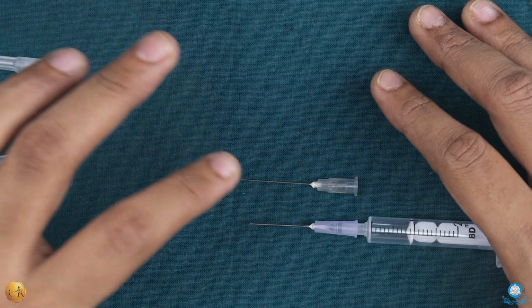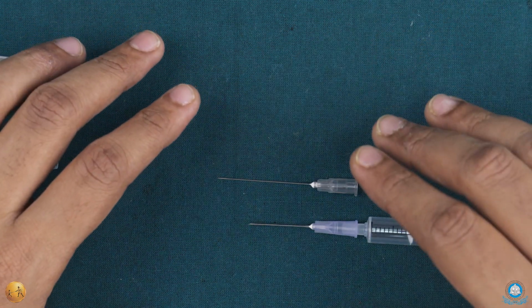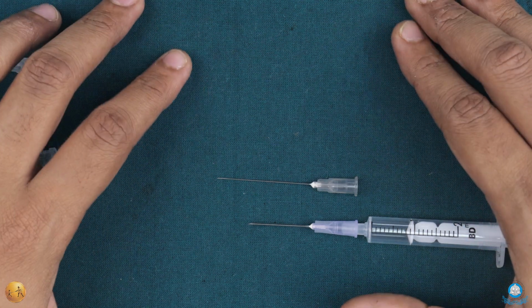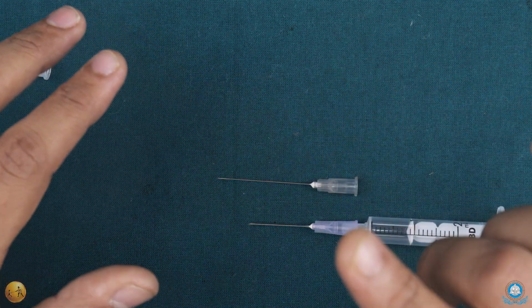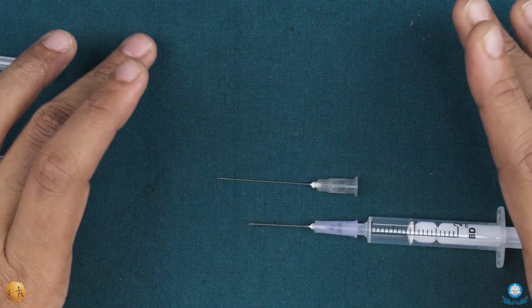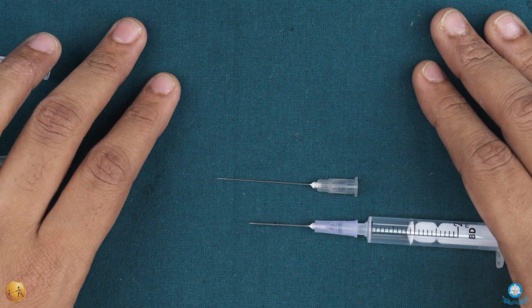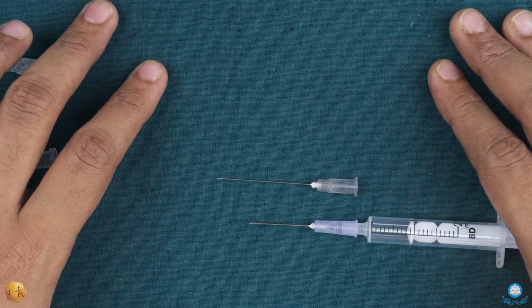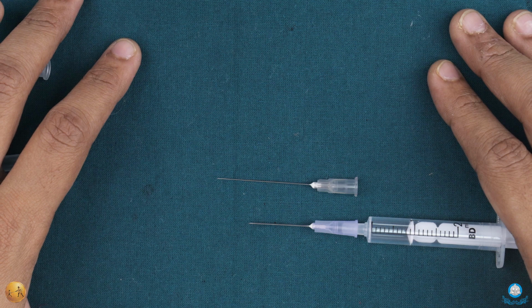Having said that, the gauge of the needle also determines the amount of deflection that takes place when you actually enter tissues. Of course, the amount of deflection of a needle is also dependent upon the density of the tissue that you are entering, but it plays a vital role, especially when you're using a longer needle, by which the needle traverses a longer distance inside soft tissue. And because of this, it is recommended to use the BRIT, or the bidirectional rotational injection technique, so as to overcome the deflection of the needle that you may actually see.